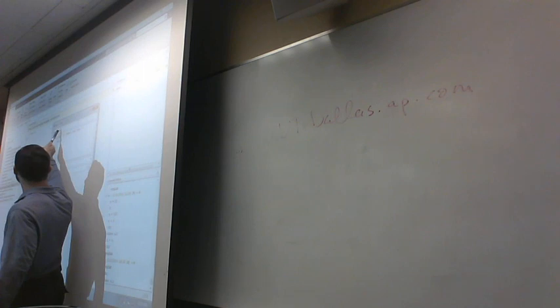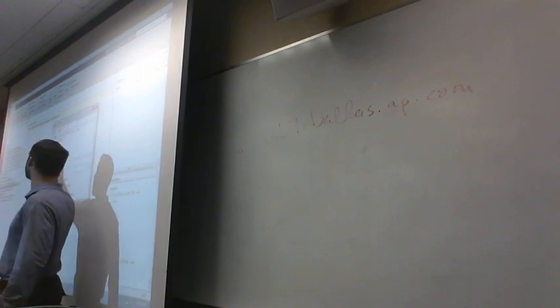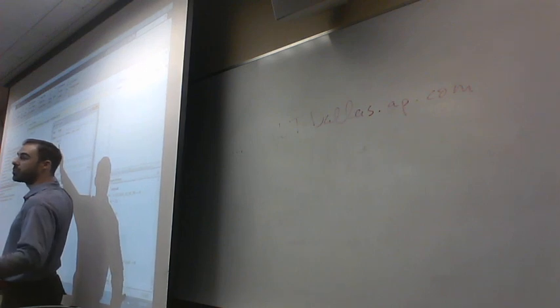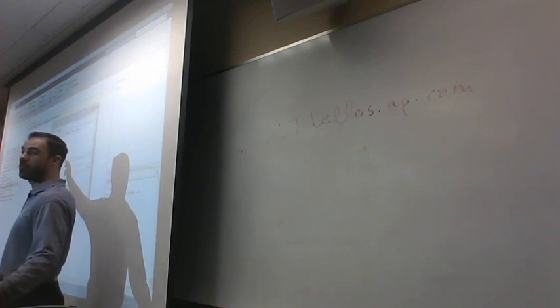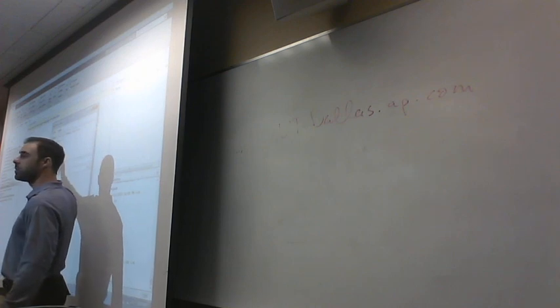We could call it, I don't know, UTD comment EEG Lab, and it's still going to bring up EEG Lab because this is the actual nuts and bolts, the skeleton, the inside of the code that's going to be commanded. So when you hit this button, it might say a goofy name up here. You can type it whatever you want. I don't recommend anything but EEG Lab, but it's always going to call whatever you type and save in here.